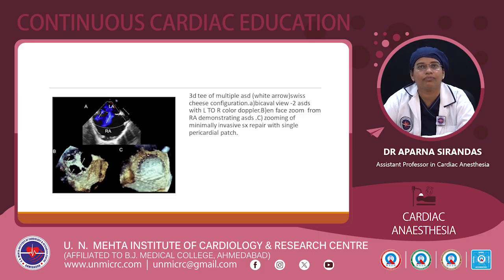And 3D TE of multiple ASDs, white arrow, it shows Swiss cheese configuration. So A, it is a bicaval view. You can see 2 ASDs from left to right in a color Doppler, and B, it is the en face zoom view from RA demonstrating ASDs are present, and the C figure is the minimally invasive surgical repair with single pericardial patch.